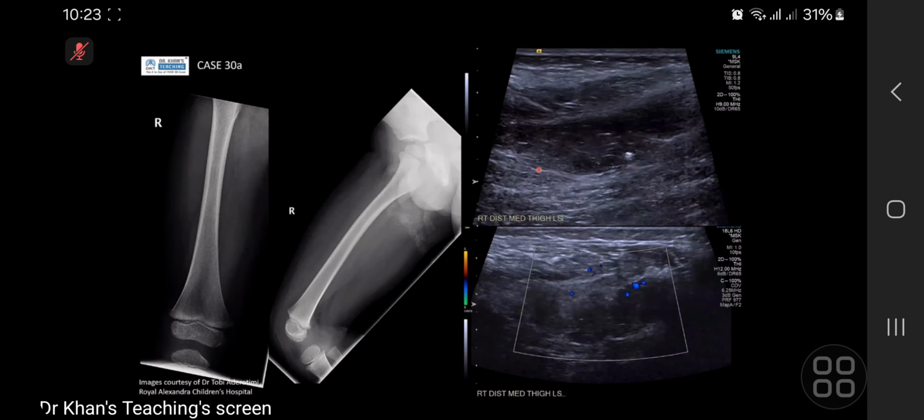Unlike hemangiomas, which are tumors, these are more ill-defined, and they also demonstrate very low flow. Some papers say you can get a bit of arterial flow, but generally they are really slow flow. So you've got to turn your Doppler settings down or use power Doppler to even pick up a little bit of flow. And the giveaway sign is the phleboliths within it, to suggest that it's very low flow.